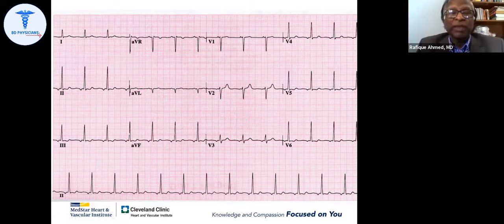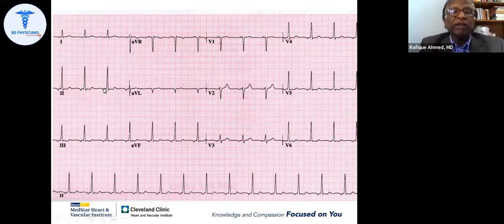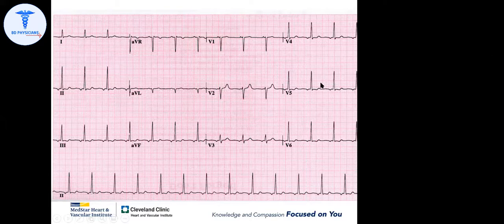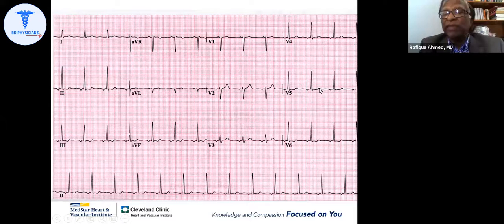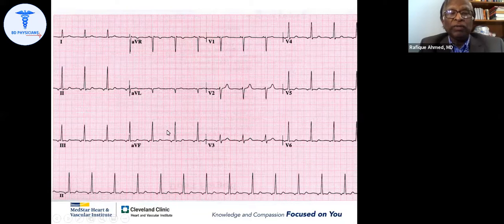Fine. So it's an atrial rhythm. Low atrial rhythm. Otherwise, sir, normal. Low atrial rhythm and other findings. PR interval is normal. QRS duration is normal, but not really normal. If you look at the T wave, they are biphasic. In lead V5, it's a little bit negative positive, right? Yes. And same in lead 2, lead 3, AVF. What is the significance? I don't know, but it is abnormal.